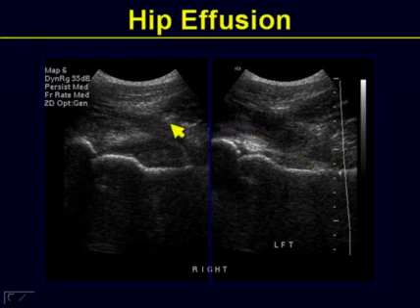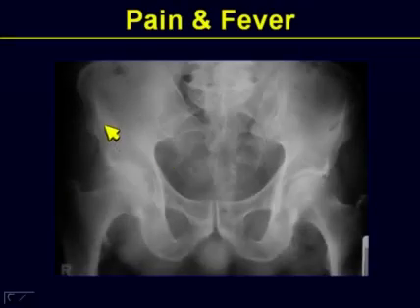In the affected hip, immediately over the acetabulum, femur, and femoral neck, you'll notice a distended capsule, and within it some mixed echogenic pattern representing an effusion. So left-right comparison is essential, especially when you address it to the non-imagers like your referring physicians or emergency room physicians. So once you are familiar with distension of the capsule, we can now begin to show some cases.